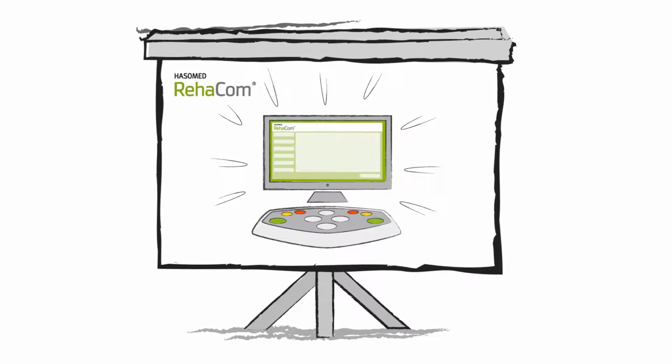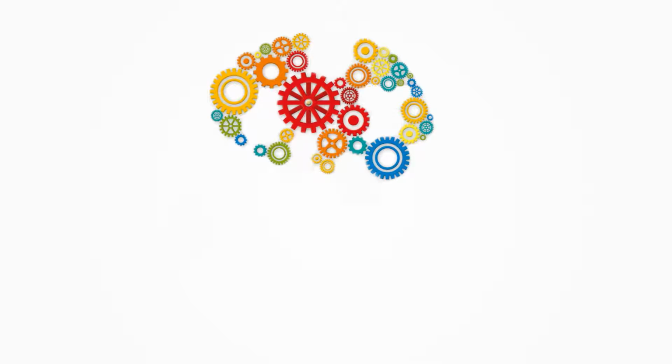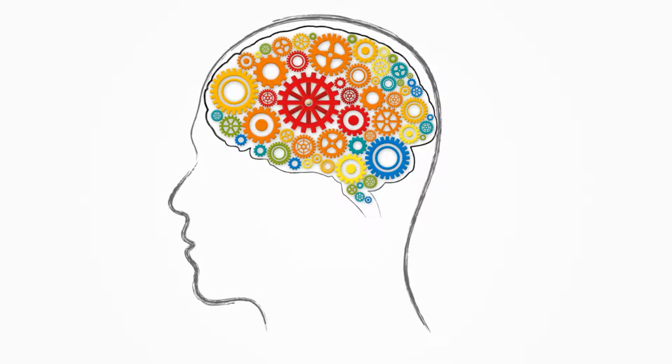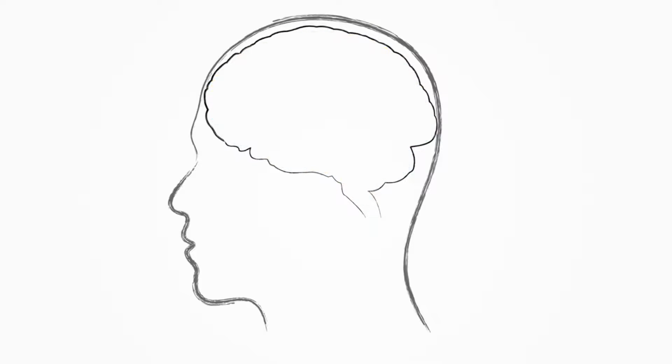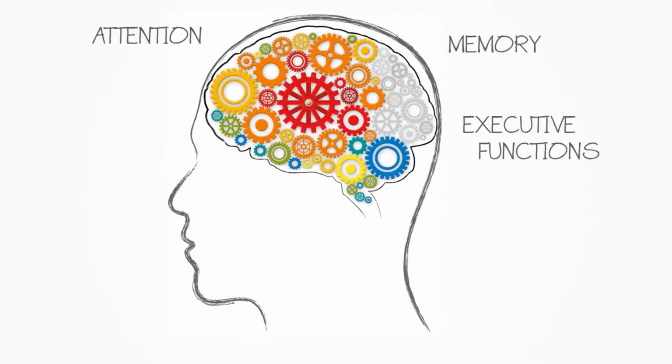Welcome! This is an introduction to RehaCom. RehaCom is a modular system used for cognitive therapy. Through regular use, RehaCom forces neuroplasticity and helps patients to improve their attention, memory, executive functions and visual field.